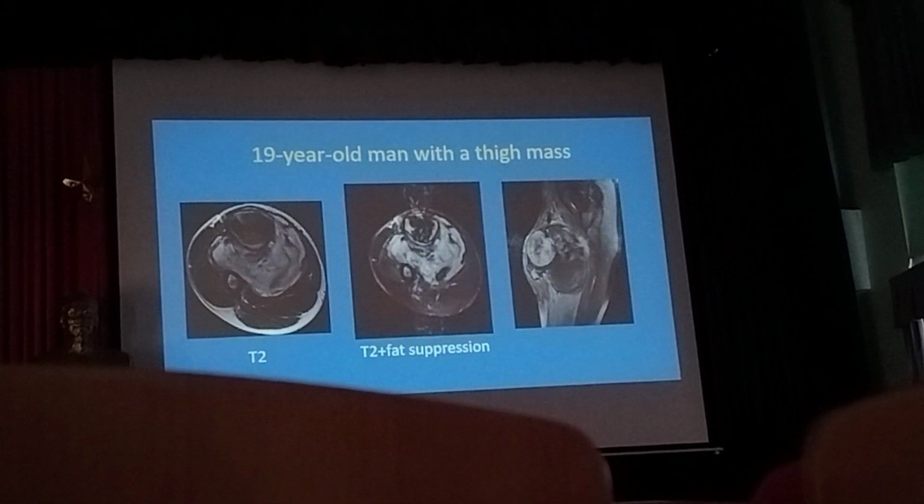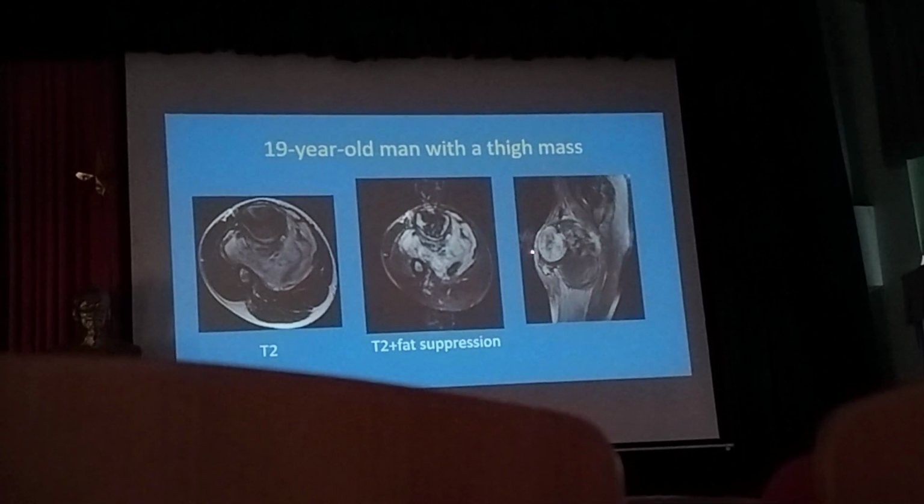And this area has enhancement in the post-contrast study.